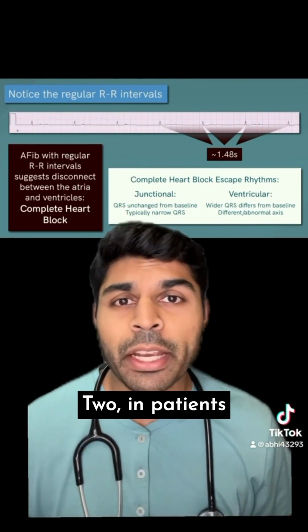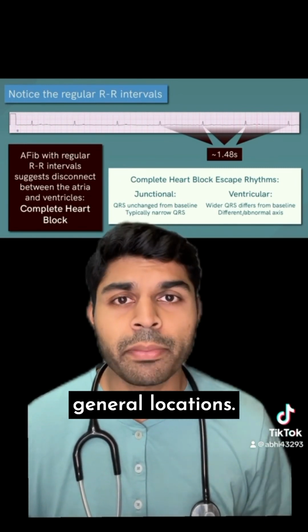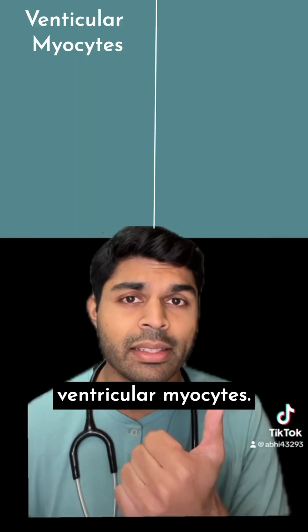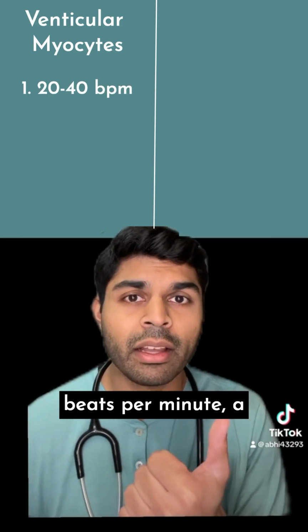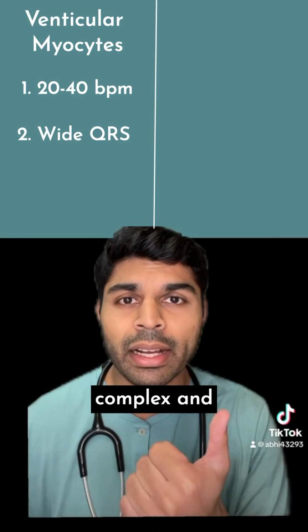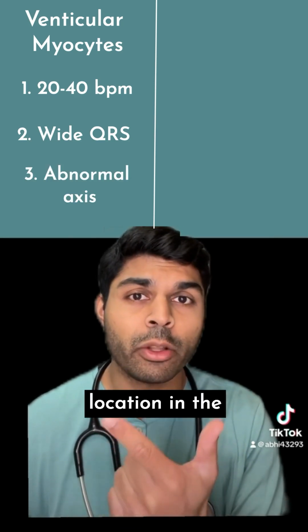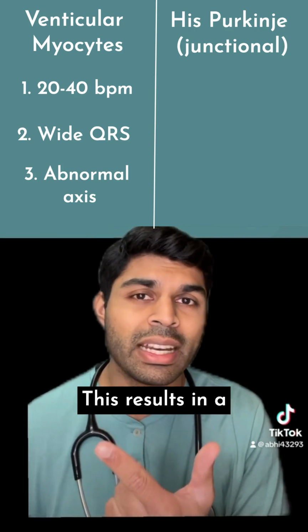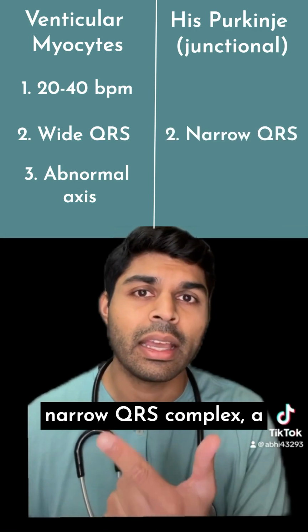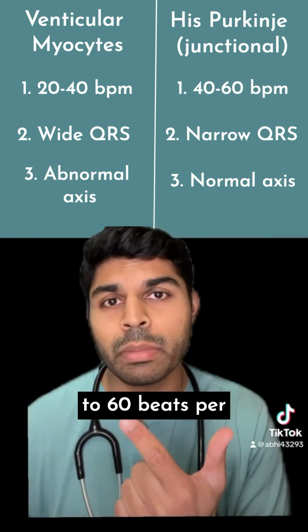2. In patients with complete heart block, the escape rhythm can come from one of two general locations. It can come from the ventricular myocytes. This results in a slow rate of 20 to 40 beats per minute, a very wide QRS complex, and a very abnormal QRS axis. It can also come from a location in the His-Purkinje system distal to our block. This results in a narrow QRS complex, a normal QRS axis, and rates that are slightly faster in the 40 to 60 beats per minute range.